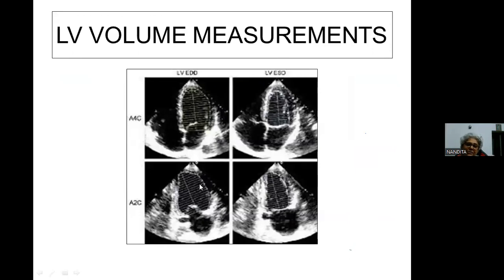So what the machine has done is each of these is a small area of the volume of the ventricle. Each of these volumes is taken separately, and then a summation of these volumes is made. So you get very close to the actual volumes by CMR and all the other methods they have been doing. These volumes are very close when you measure by this method.